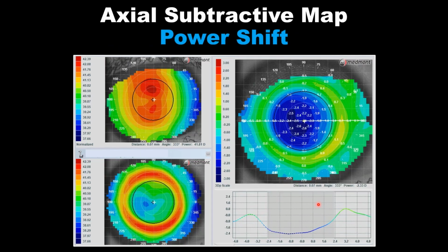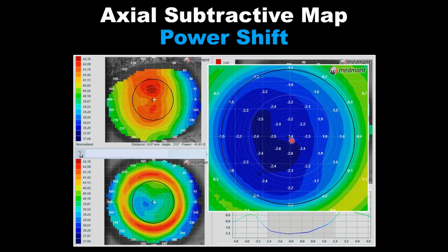Another thing you can do is switch to the numeric meridian map. And I only use this in myopia control. I find it just clutters the topography, at least for me personally. Some practitioners prefer to know the radii all the way across the surface area. Well, let's zoom in on the center. We see that this patient goes from 2.4 diopters on the visual axis, so 2.5 diopters of flattening, down to maybe 0.4 diopters near the pupil.